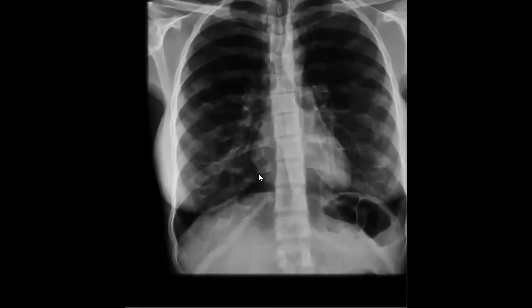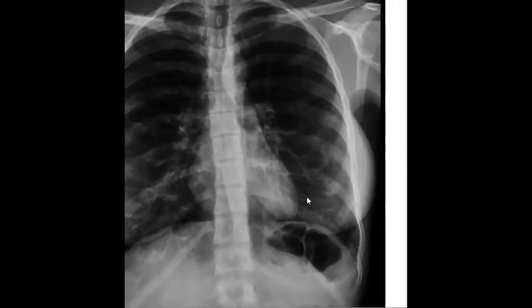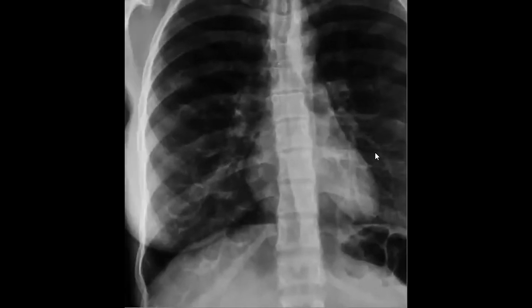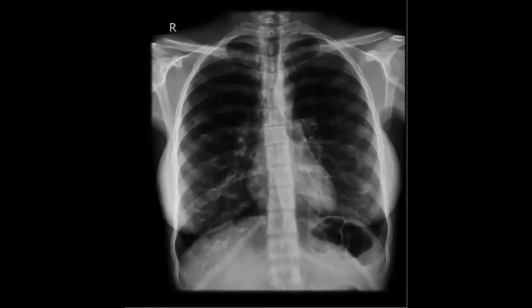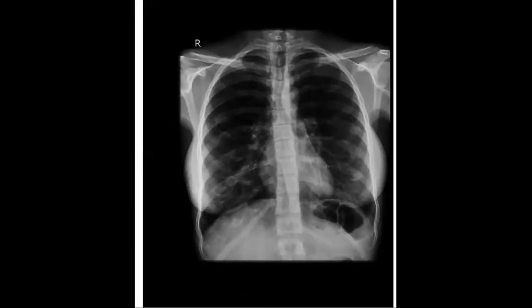We saw the first case today. It was allergic bronchopulmonary aspergillosis, which was a type of focal bronchiectasis in the left upper lobe. But as you know, sometimes the bronchiectasis can also happen in the lower lobe. If you focus and check the lower lobe, you will find some cystic areas here. The most important differential diagnosis to mention is that it could be cystic bronchiectasis, then the examiner will ask you about the differential diagnosis, especially of lower lobe bronchiectasis and the causes.